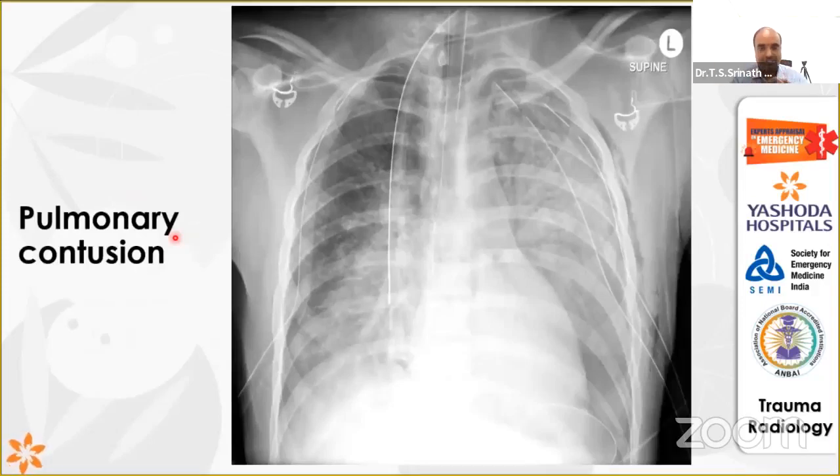Next slide, please. What is here? What do you see here? Pneumothorax, emphysema, collapsed lung. What do you think so? I'm getting multiple answers here.